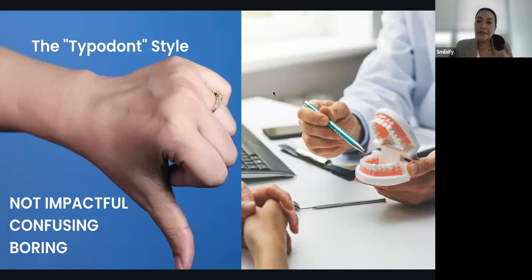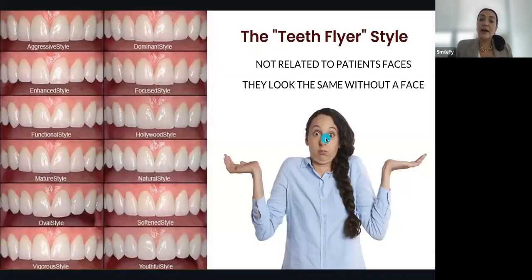The typodont style is not working right now at the moment. Another thing that I have here in the office is that flyer. Believe me, I have seen this a lot of times, where you give the flyer to a patient and the patient selects, as from a menu, what kind of smile they want to have. But do you agree with me that when the patient sees that flyer and they don't recognize themselves in this picture, it's going to be hard?